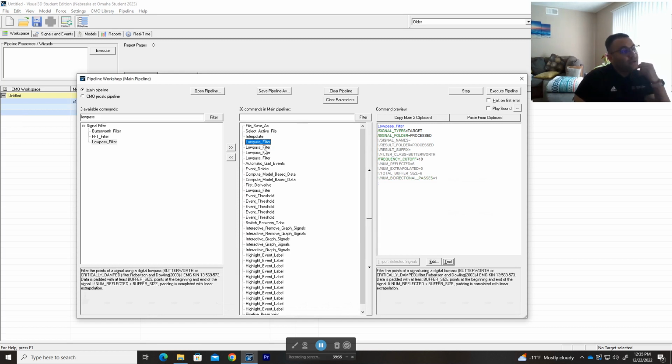And here, if you notice, I have 4 low pass filters. So I filter my kinematic data and I filter my analog data, so the kinetic. Also, here I have this because I also collect EMG, so I basically run the analog for both the EMG and the kinetic data, the force plates.